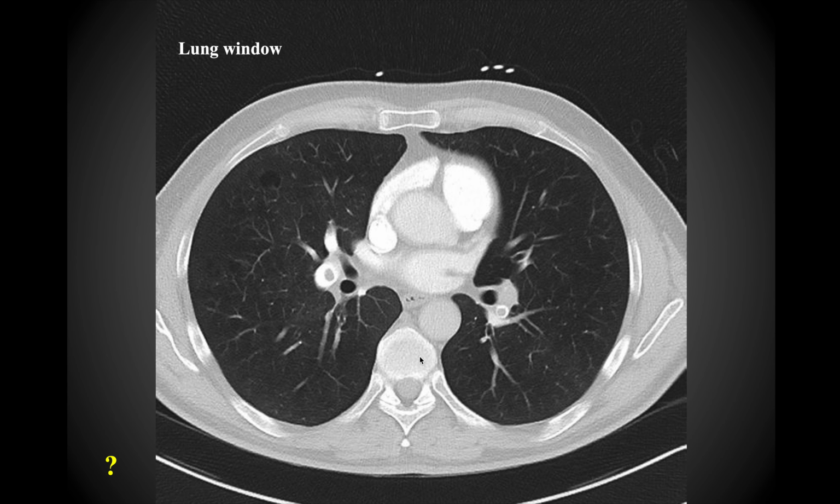So again, find your thoracic viscera or vertebra, locate the descending aorta. Here's your ascending aorta. This is going to be probably the end of the SVC, moving into the right atrium, right ventricle over here, and then back here is going to be the left atrium. And so these dark areas back here are going to represent the bronchi, but you can see again that they've clearly already branched. So you're looking at probably the tertiary bronchi at this point.